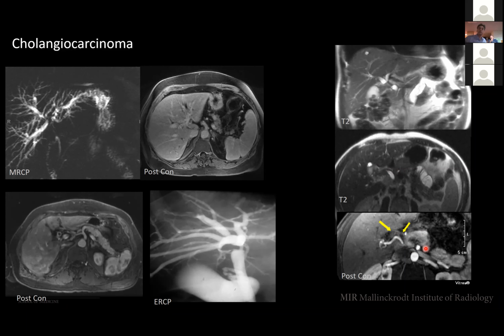One thing that did catch us as atypical is the very smooth nature of the soft tissue and the fact that the degree of soft tissue component and the degree of biliary ductal dilatation were not in sync. This ended up being a lymphoma involving the bile duct.